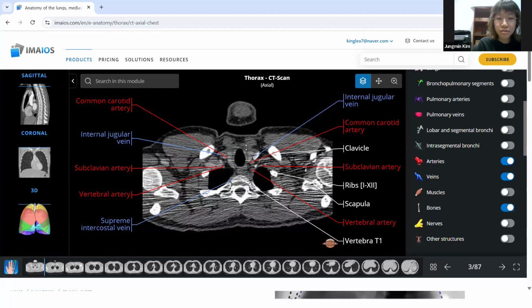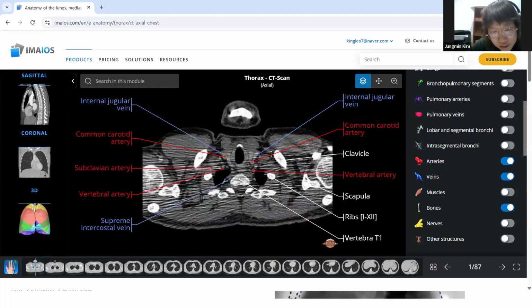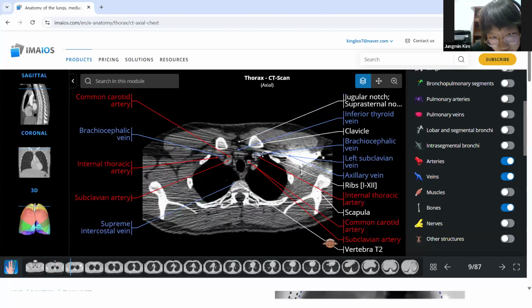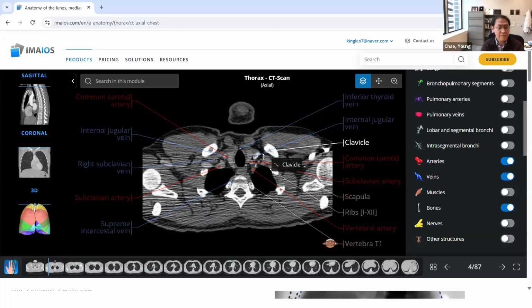This is a normal patient CT, so it doesn't have an enlarged lymph node to look at. Oh, okay. Yeah, just look at the anatomical border. So these nodes are especially important. It's easy to look for with PET. If cancer spreads here, it can indicate more advanced disease. So I think mostly people with enlarged SCN have it somewhere here, vaguely. So look for it.